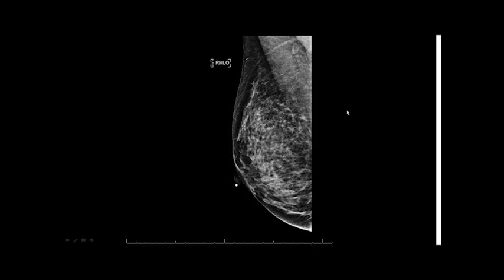Let's talk about this image. I don't like it. Why? There's absolutely no IMF. They will give you a huge mark on that, but the nipple is in profile. I like the wide superior muscle all the way down here, 45-degree angle. This is a very, very dense breast, but I would not send it in without that IMF. That is very high criteria, and that's one of them. IMF is up there on the list.